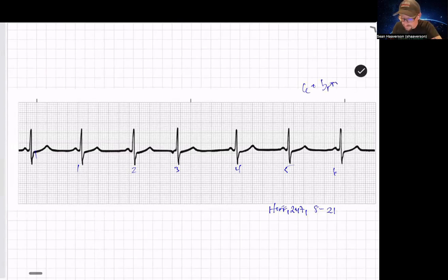Yeah, I don't think this qualifies. So yeah, 60 beats per minute. Okay, we have a P wave. So good, good, good. Looks the same. Okay, we got a change here, and the next one doesn't look the same. P wave, P wave, P wave. Okay, good. Our PR interval is a little longer than it is.